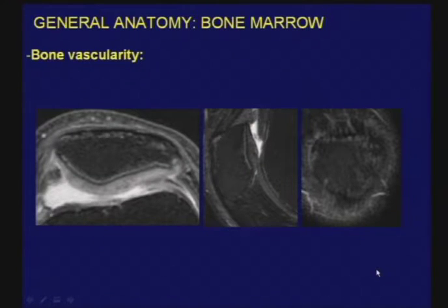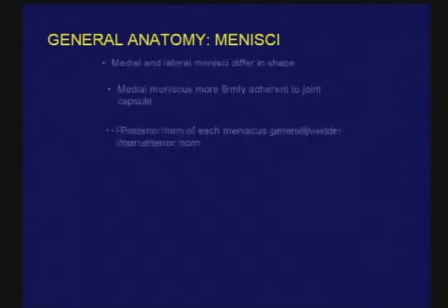This indicates hyperemia, as I mentioned the other day. It is not specific for a single condition. It can be seen in a variety of conditions. It can be seen in any cause of aggressive osteoporosis. So certainly something we could see with reflex sympathetic dystrophy or regional pain syndrome, and even sometimes in cases of disuse osteoporosis. It's also been described in an article indicating it is a finding in the subacute phase of an injury to the knee. So following an injury, you may see this bone-within-bone appearance. By itself, it certainly does not cause pain.